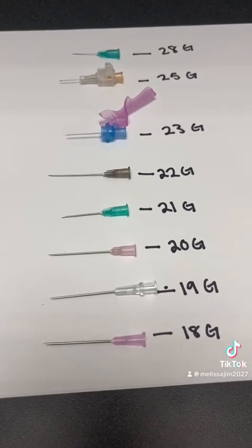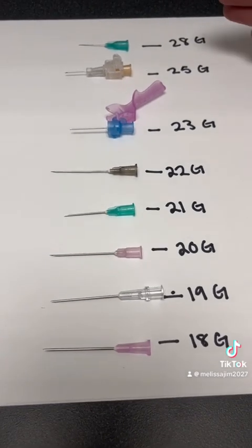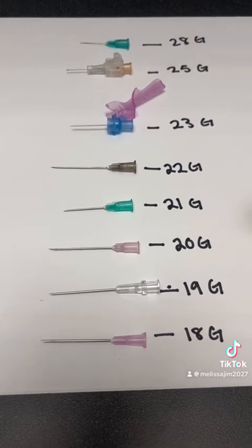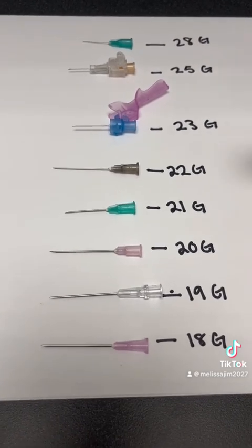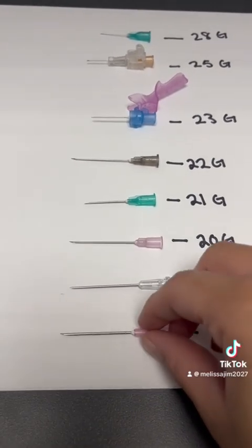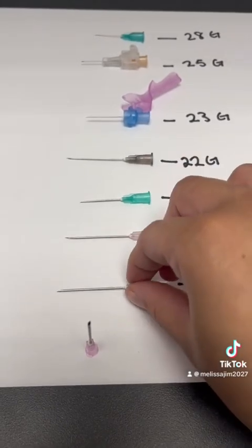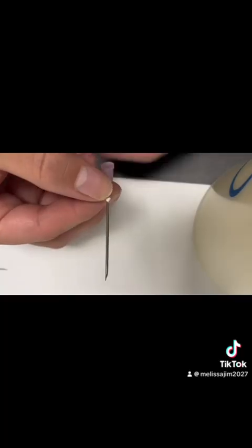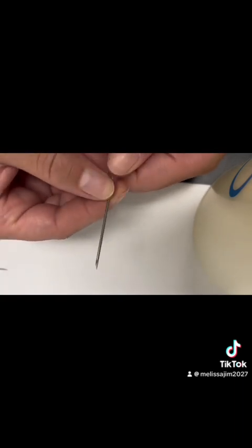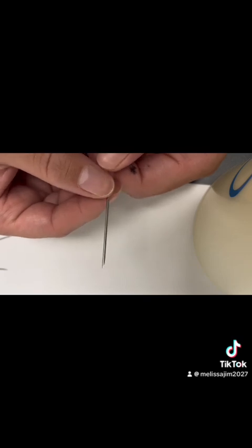Let's look at the different gauges, okay? Here, these needles are not all the same length, okay? Some are 1 inch, 1.5. I think there's like a 5/8 one. But I just want to show you what the gauge looks like up close. Here we're looking at an 18 gauge needle. This is not the biggest needle. It goes down to like 14, 12, I think even 10.